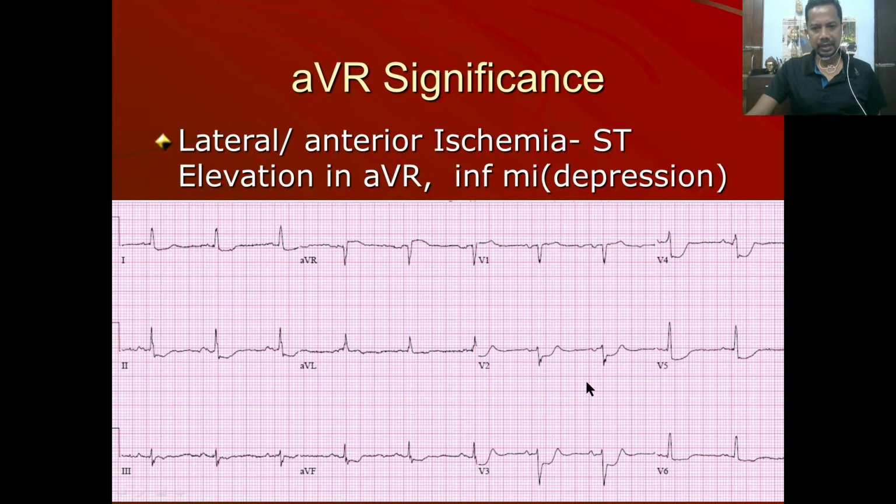So this is again, you see the level of ischemia, lead V2, V3, V4, a lot of ischemia is there. And how do you determine where the ischemia is? Now the PR segment is the isoelectric line, so everything has to start and come back to that point. Now out here S is starting, but it is not reaching here.